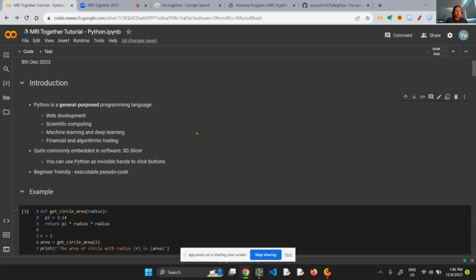So it's just like an invisible hand to do everything for you as long as you know exactly what to do. So in 3D Slicer, which is an open source tool to visualize and analyze imaging data, what you can do is down to each button or how long you can wait and click which button. You can do very surgical movements with Python, and everything is built in.